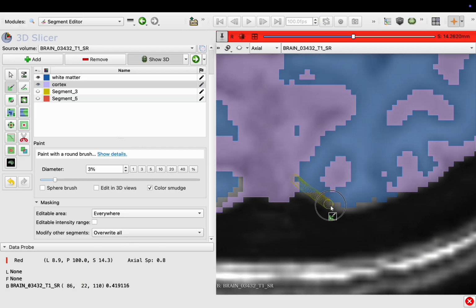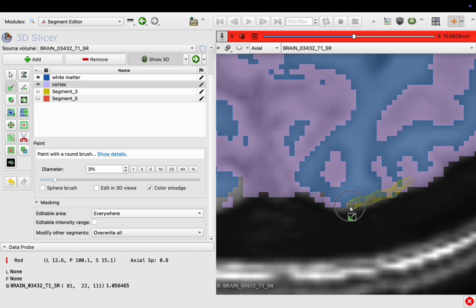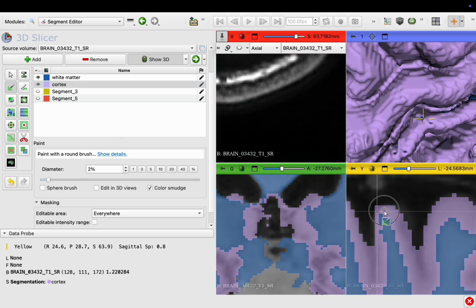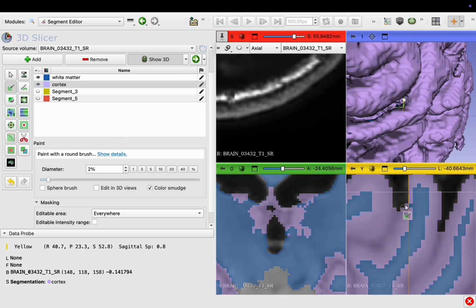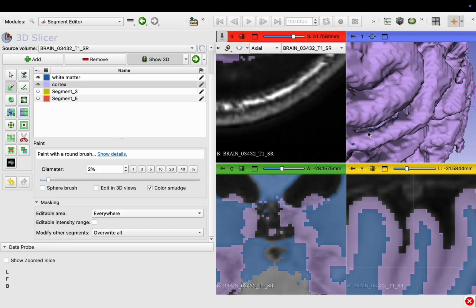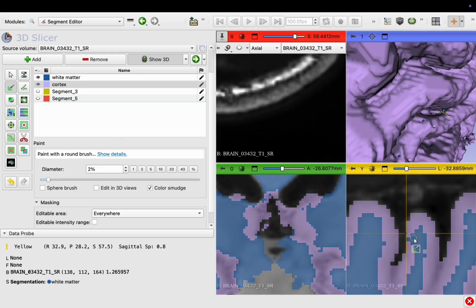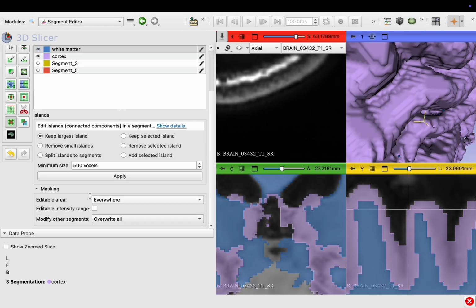Another point worth mentioning is that there is a box called color smudge in the settings that I've checked. By checking this box, you'll be able to draw one segment into the adjacent area. For example, I draw my cursor from the adjacent pink segment to the area that is undersegmented, and it will grow or draw this pink segment into the region that I want.